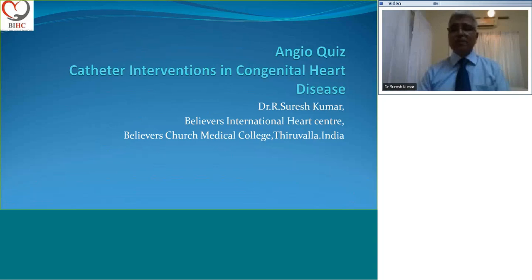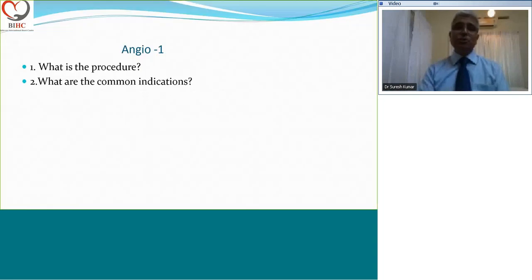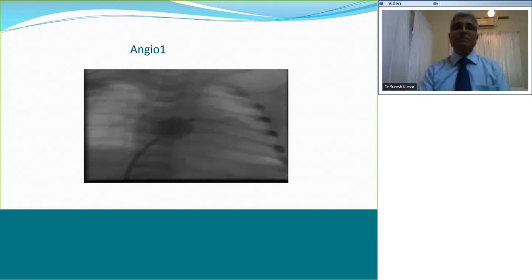The first one, Akshita, you have already seen. Just tell me what is the procedure and when do we do this. You can send it to me as chat. Yes, you're correct. It is balloon septostomy. Tell me the common indications.